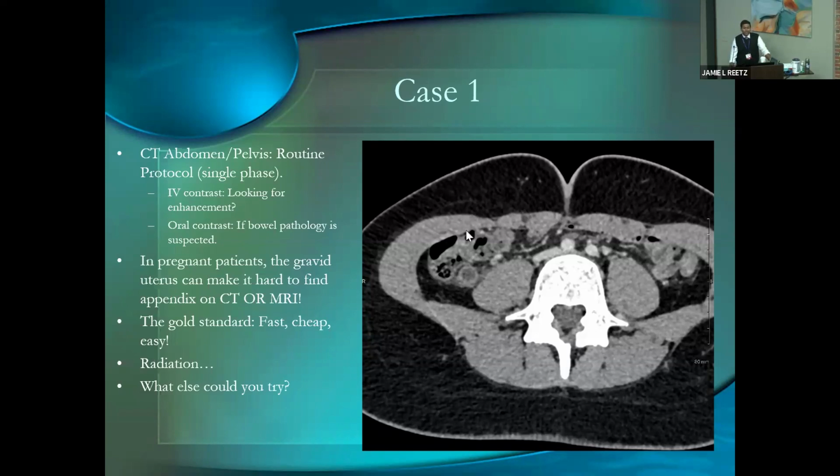And again, the idea here is the MRI on a pregnant patient with a gravid uterus, it can be kind of hard to find that appendix, but you can still do it.